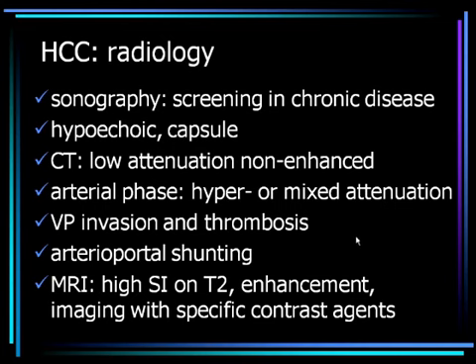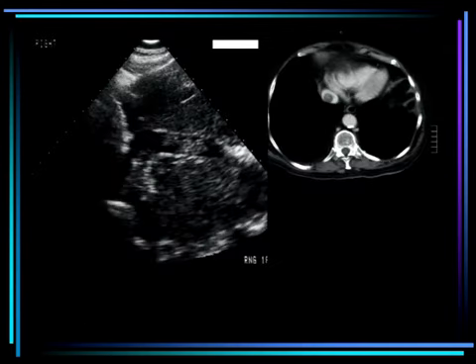And on MRI, the lesion is non-specific also. We might have high signal intensity on T2, and we have enhancement. And the most important thing, the contrast agent companies demonstrate that today, using hepatocellular directed contrast agents, you can proceed to the diagnosis.